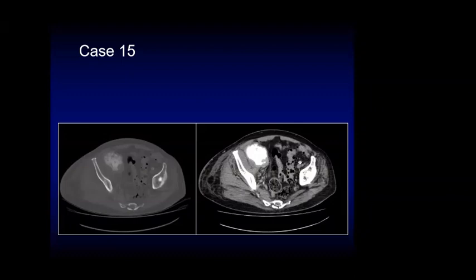The lesion is away from the bone, no obvious cortical erosion. Any contrast, Dr. Harun? No, I think this one here is less contrast, but it's really just to show you, maybe if we focus on the bone window.